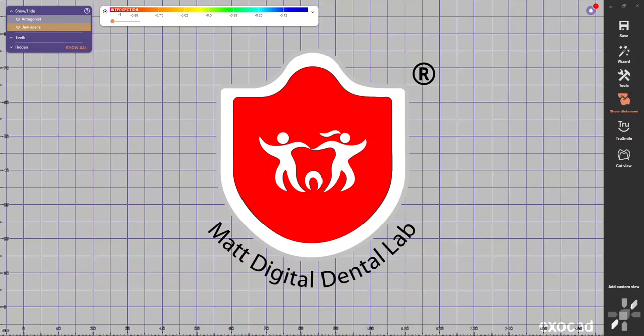Welcome to this comprehensive video demonstration on designing dental crowns using Exocad software. So in this video tutorial I will guide you through the step-by-step process of designing a 6 unit lower anterior bridge.